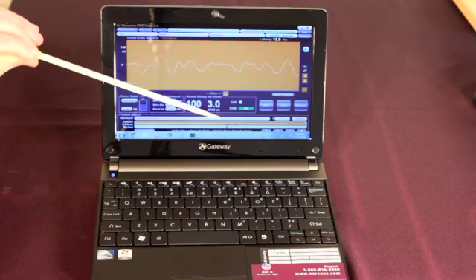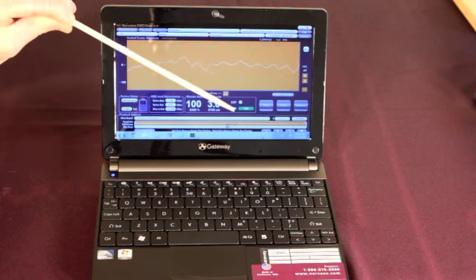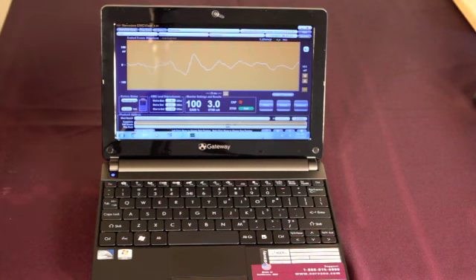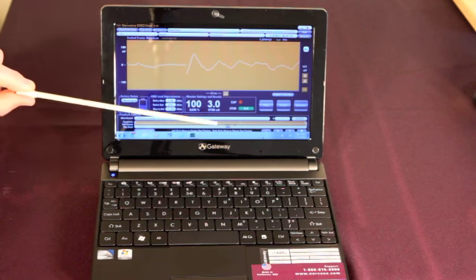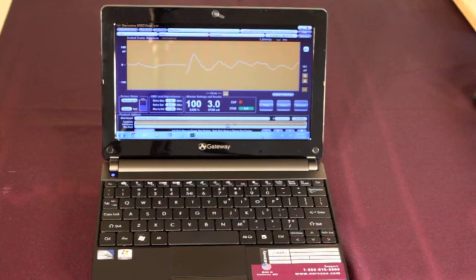And you now note that the blue bar is advancing, my cap light's flashing, I see stimulation full. This is where something significant happened during the surgery. And now the blue bar has stopped advancing because it reached the red line. That's the end point that I moved up.